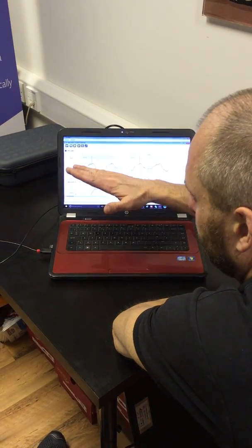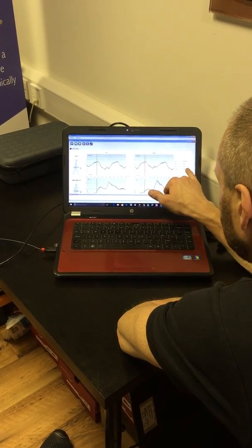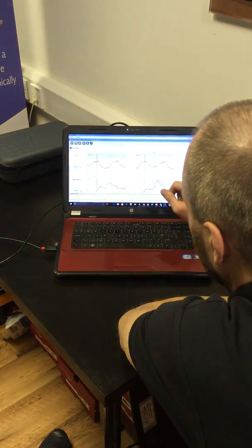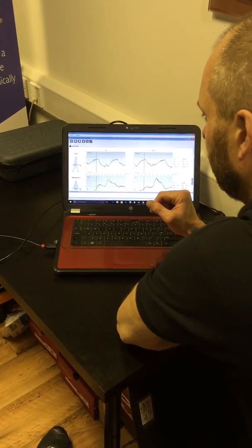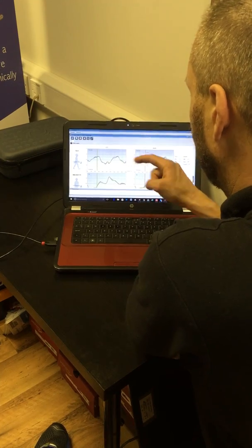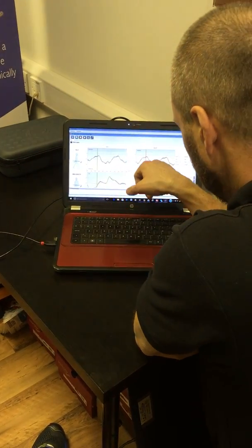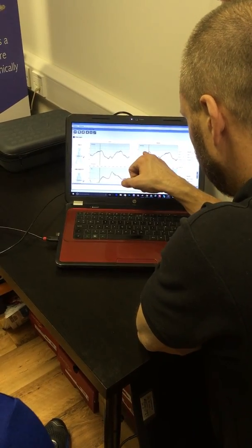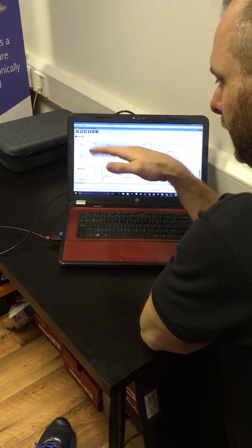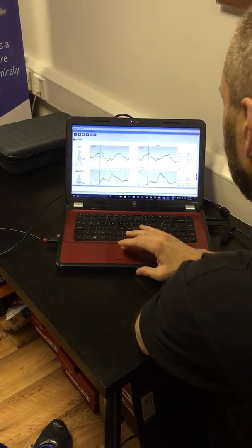If you look at that, when you tilt forwards, tilt backwards, your minimum for left and right are the same, your maximum for left and right are the same, so your range is the same. Then we start to analyse the squiggle itself, and we could argue that it's not too far off. The minimum maximums do pretty much mirror themselves. We're measuring lots of different points, and we've got a bit more spread at certain points. But apart from that, in terms of your pelvic tilt, I'll be pretty happy with that, given everything else that we've got going on.